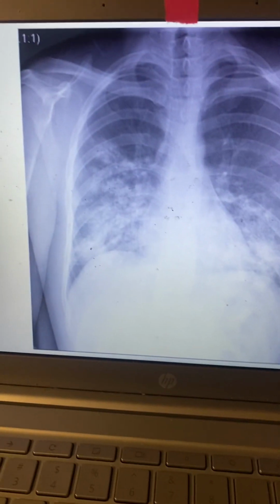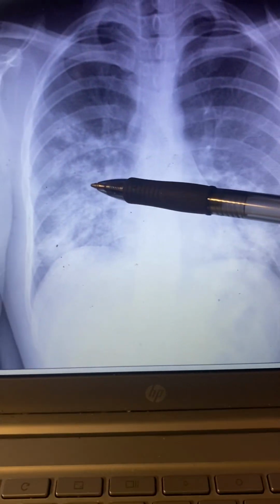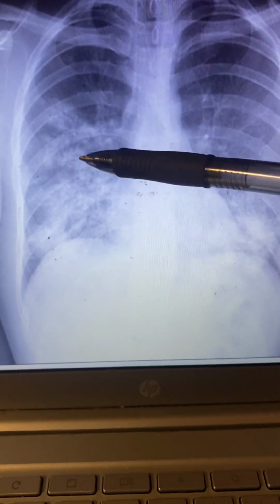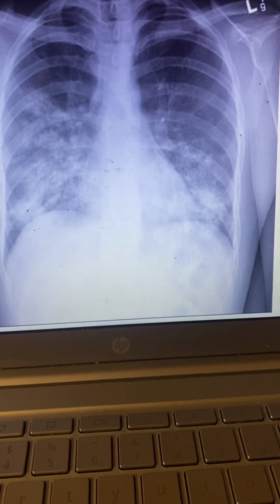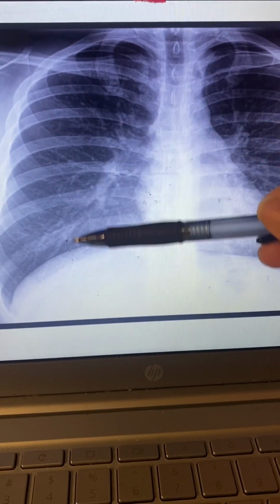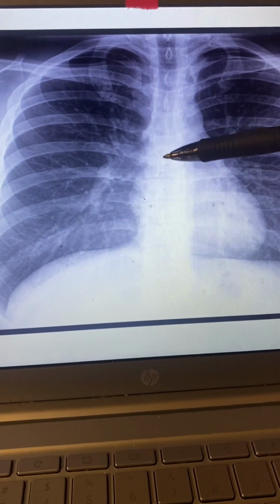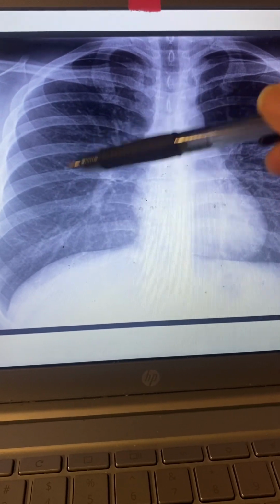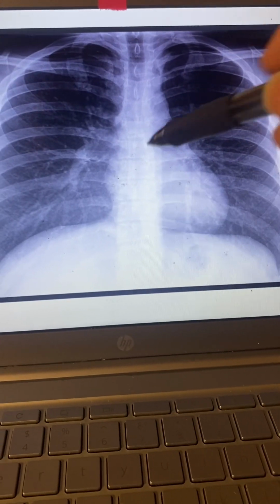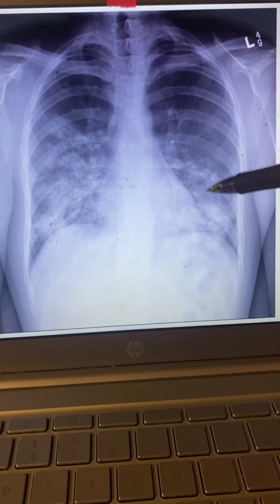So next we have pulmonary infiltrates. You can see them all throughout these lower lobes in here. Oh, and let me back up here. If this was more than half the border, for the cardiac border, that would be indicative of cardiomegaly. So you would see like an enlarged heart. Okay, and then this is the pulmonary infiltrates.